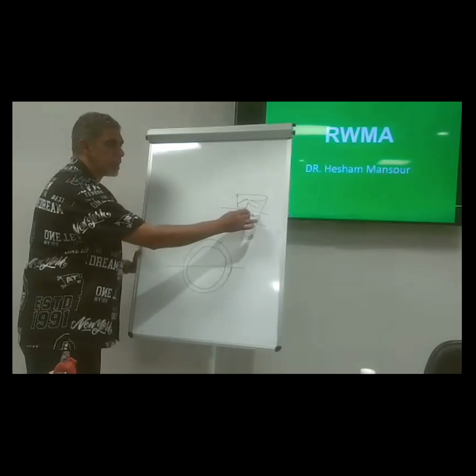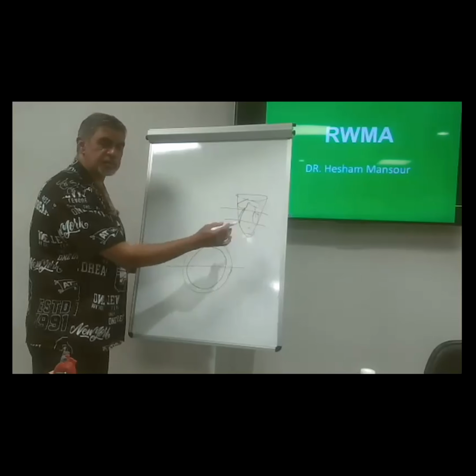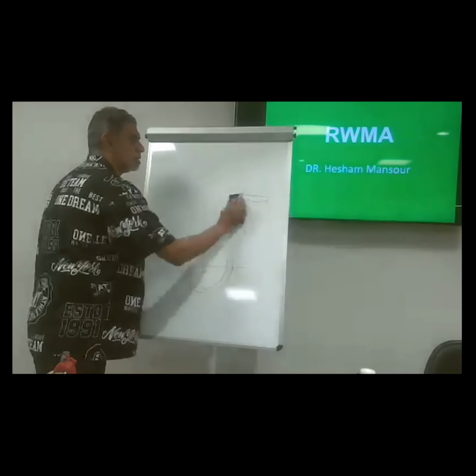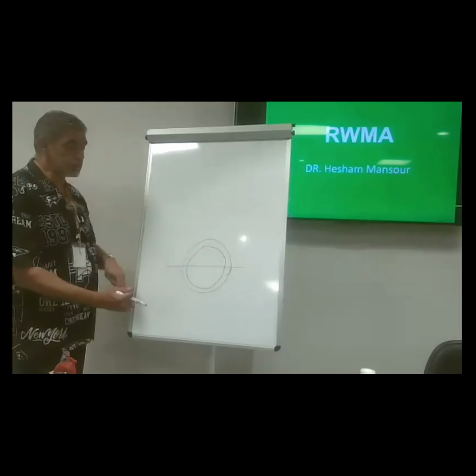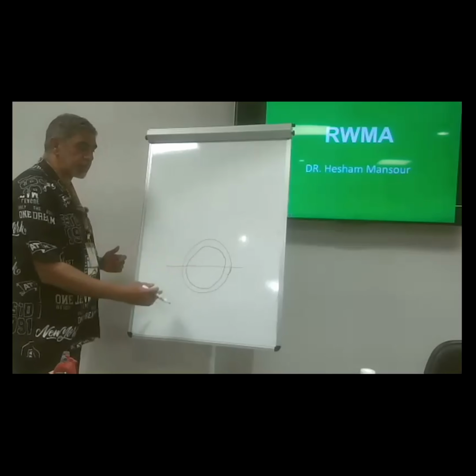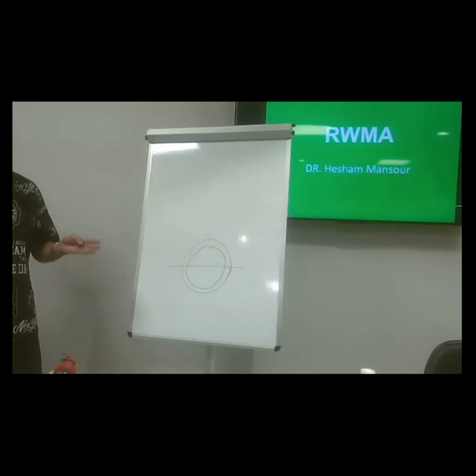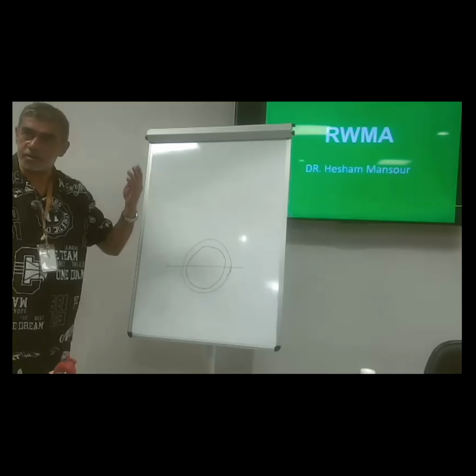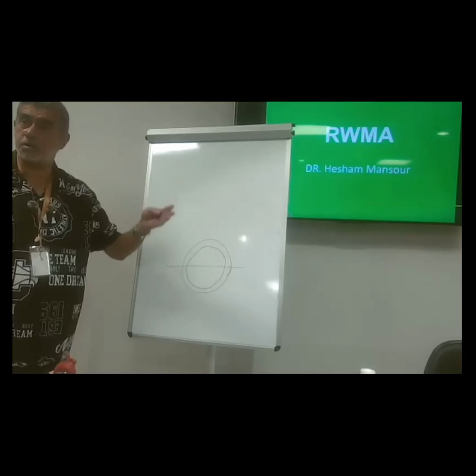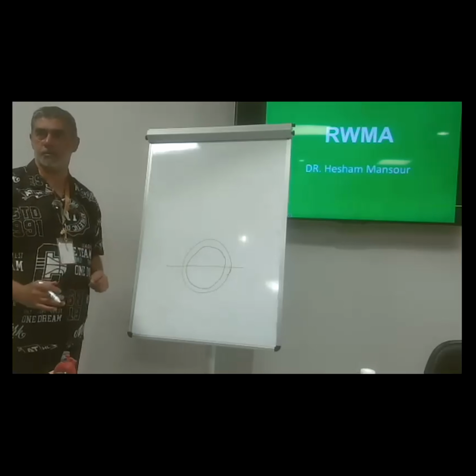This, by the papillary muscle. And this, by nothing. If I told you this is transgastric short axis and asked you which level? Apical. It has neither the leaflet nor the papillary, so it is nothing. So it is the apical.